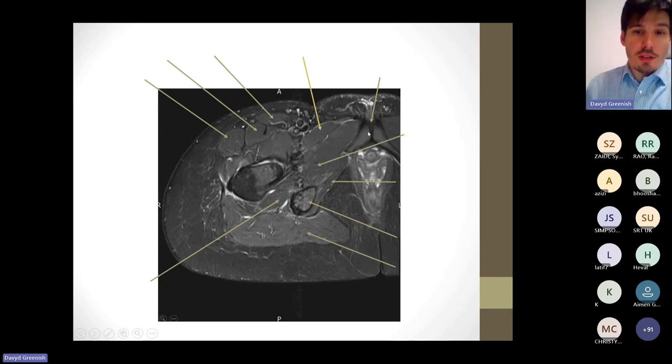In the meantime, we'll go through some of the other localizing anatomy. Yeah, very nice. Perfect. So we've got pectineus muscle. At this level, you've got to orientate yourself to the level first, because at other levels other muscles can look quite similar. We've got the obturator foramen here, and you can tell because you've got the pubis here and the ischial tuberosity down here. The most anterior muscle there is the pectineus. I think if pectoralis sits at the front, pectineus sits at the front. That was my way of remembering it.